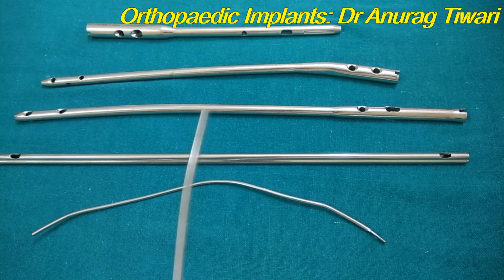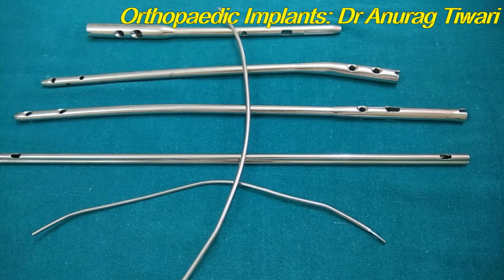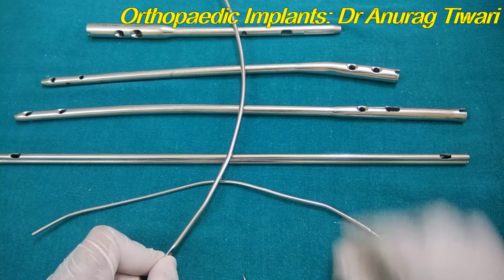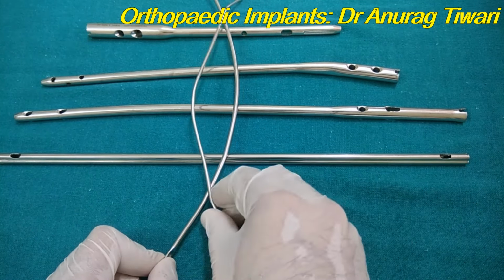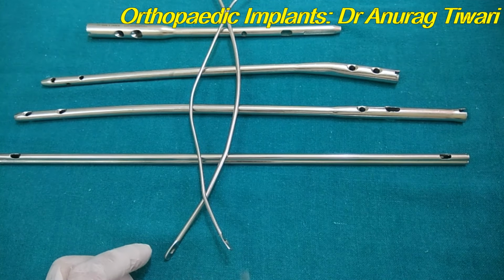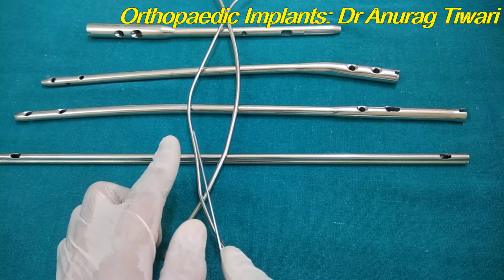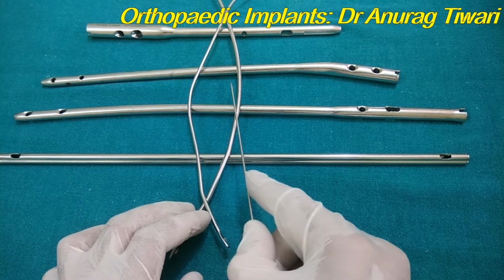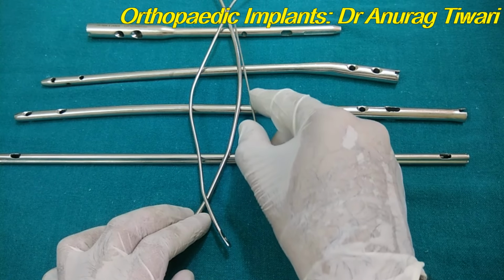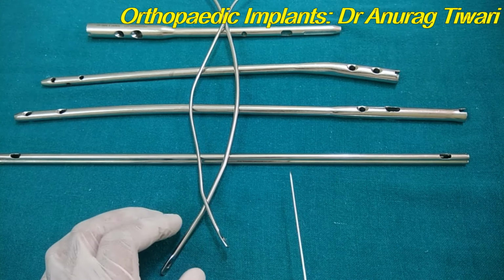For example, if we want to put it in the femur, we will make an entry point over the distal femur metaphysis on the medial side and one on the lateral side. So in this way we are going to fix. Now if you assume that this is the femur, this is the distal femur, this is the medial side, this is the lateral side, we insert these two nails, we reduce the fracture, and at the fracture site the nails are wide apart and they are crossing proximal to the fracture site and distal to the fracture site. So this gives a 3-point fixation in the fracture.